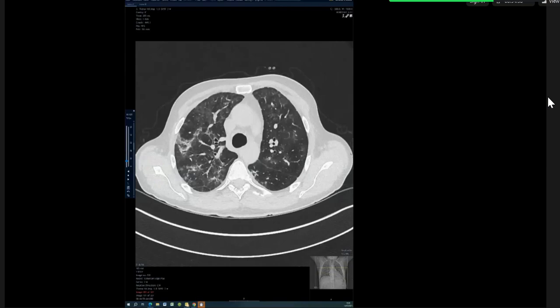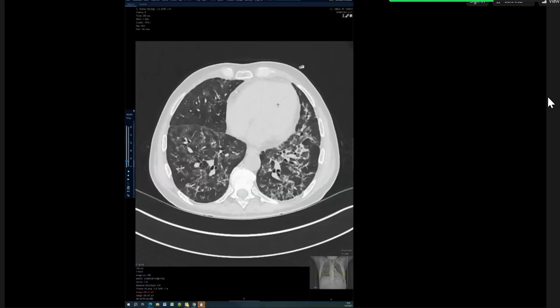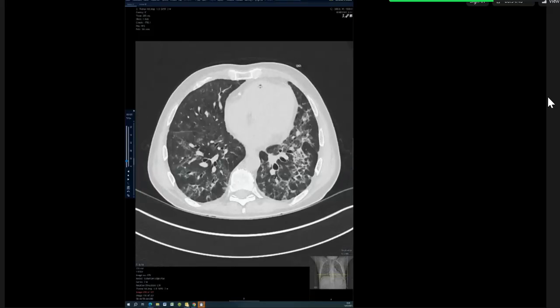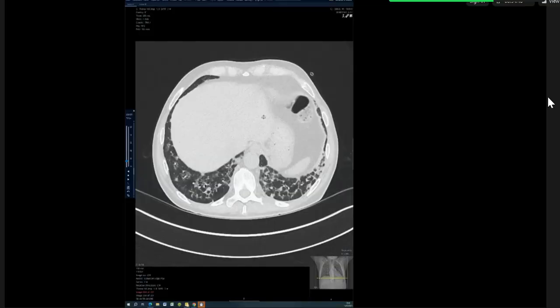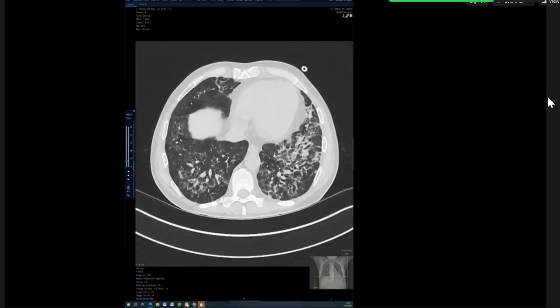And I would say, yes, the patient started nitrofurantoin 3 weeks ago. And 2 weeks ago, their cough started. So this is actually a nitrofurantoin lung, and this is starting to fibrose. It's drug-induced interstitial pneumonia. Exactly, that's the diagnosis here.